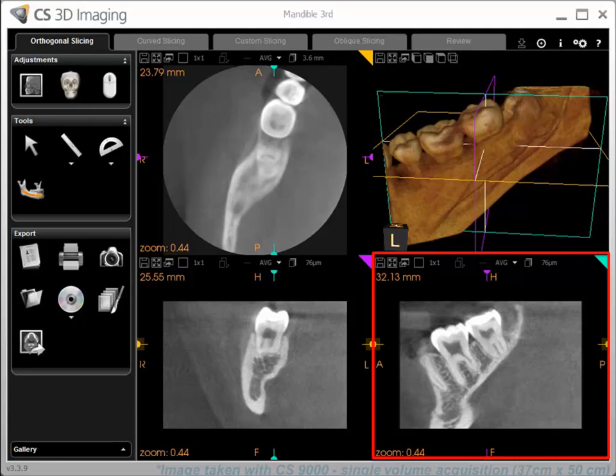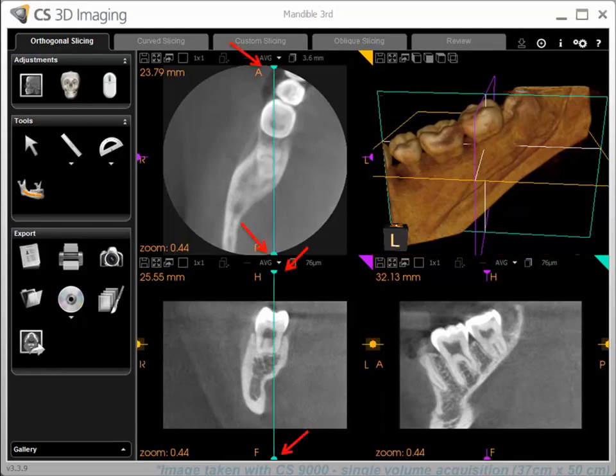The green-colored triangle represents the sagittal plane. This plane displays a cut through the anatomy from medial to lateral, separating the left from the right. The sagittal plane view can be adjusted by moving the green control points in either of the other MPR views.